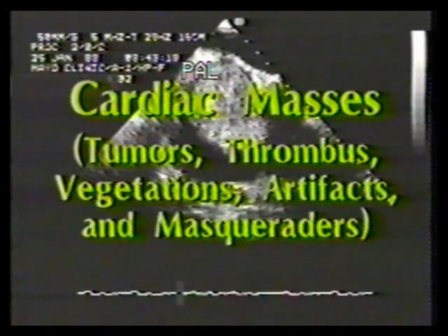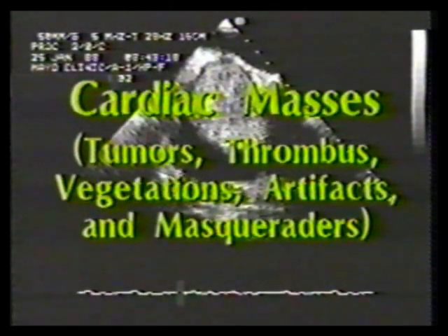Confident, non-invasive visualization of masses and clots within and about the heart are a unique and often superior attribute of two-dimensional echocardiography. This tool has revolutionized the diagnosis, understanding of pathophysiology, and management of cardiovascular tumors, thrombus, and vegetations.